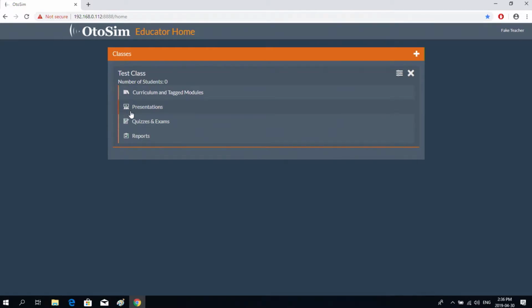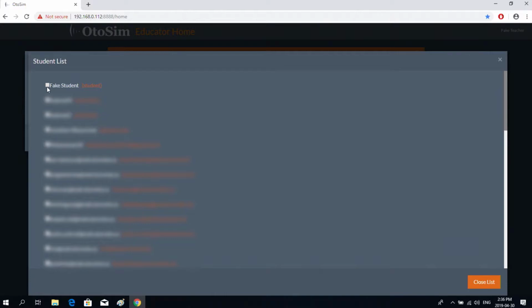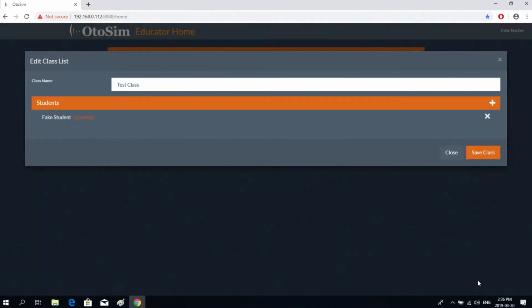This is the curriculum, presentations, quizzes and exams, and reports for me as an instructor or as an educator for my class. So I don't have any students in this class, so how do I create the students in my class? If I go to this button, edit the class, this comes up, the class name, the students. I want to add a student. In this class, I'm gonna just select one. So I got one student in my class, and the name of that student is a fake student. And I save the class.